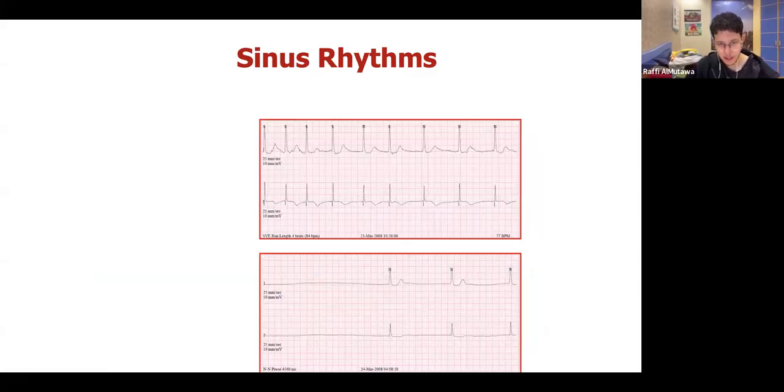What about these? This one might be a little bit difficult, but I believe in you guys. And remember, be systematic. Someone said the correct answer.